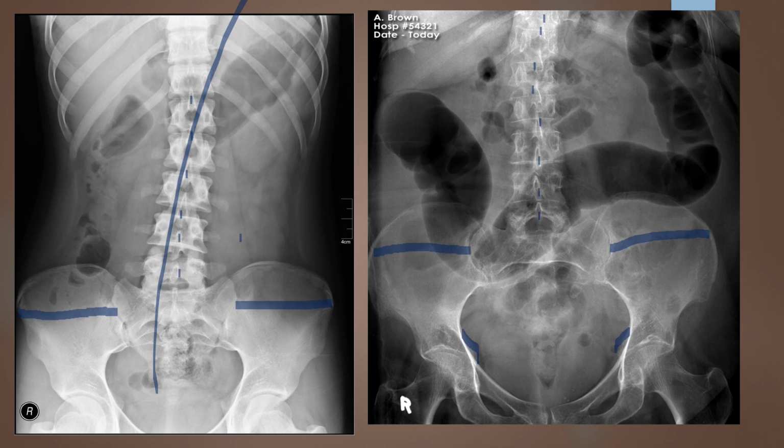So mid-coronal tilt looks like we do actually have some, mostly in the pelvis, that is affecting it. Now, I'd have to take a real close look at this patient and see if that's what they seem to be doing. I might repeat it if they could correct that. If they're holding themselves that way because of pain, then everything else is so good on this image, I might just let it go.